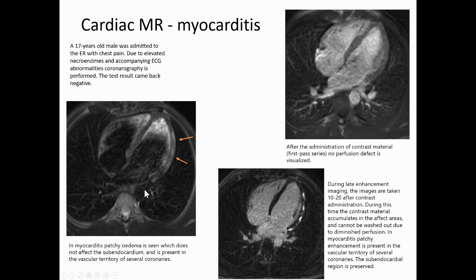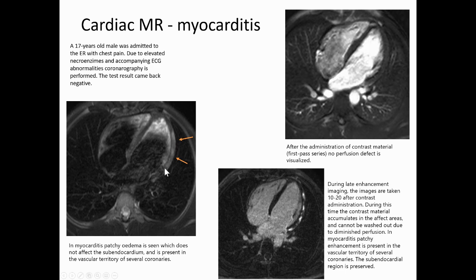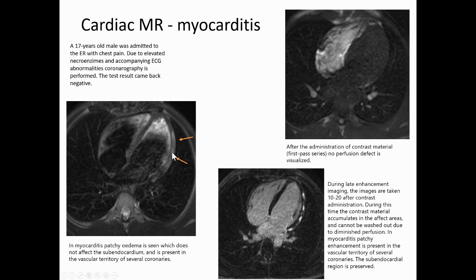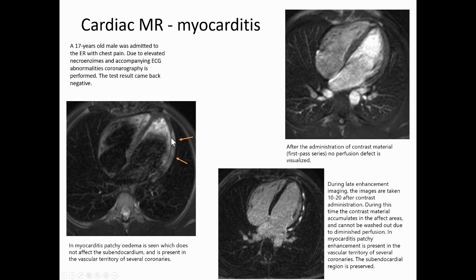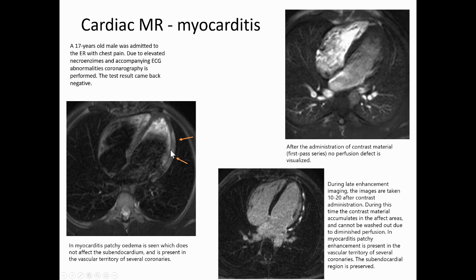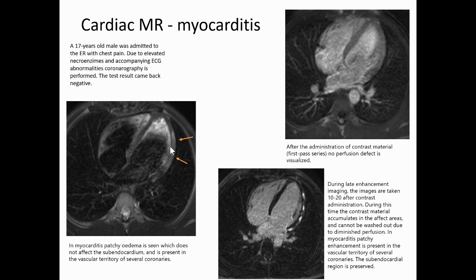However, if you look at the T2, you are looking at areas with increased signal, meaning edema. However, this edema doesn't affect the subendocardium, so the area that's closer to the chamber.